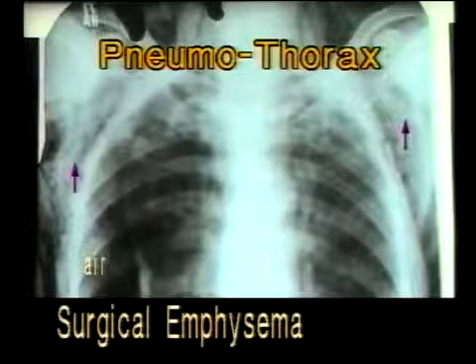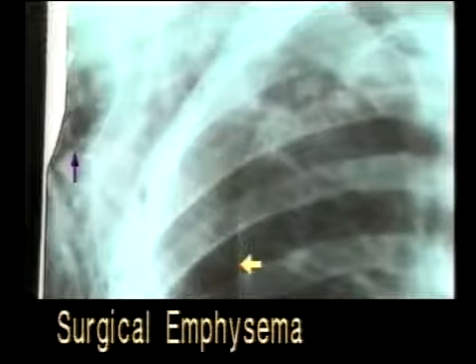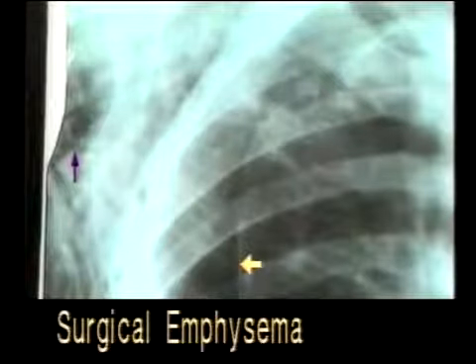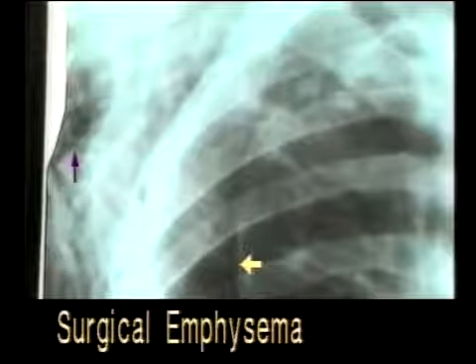If the pneumothorax is traumatic, you should look for rib fractures and inspect the subcutaneous tissues for surgical emphysema. In this X-ray, note the pneumothorax on the right side and note the air in the subcutaneous tissues shown by the black arrows. The air in the subcutaneous tissues is termed as subcutaneous emphysema. The black arrow shows the air delineating the subcutaneous tissues and the muscles. And the white arrow marks the lung border, lateral to which is the radiolucent shadow of pneumothorax. Now a careful inspection of all the ribs will reveal a rib fracture which has caused the pleural injury and air leak.